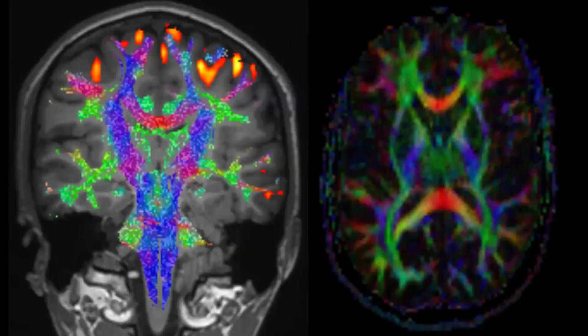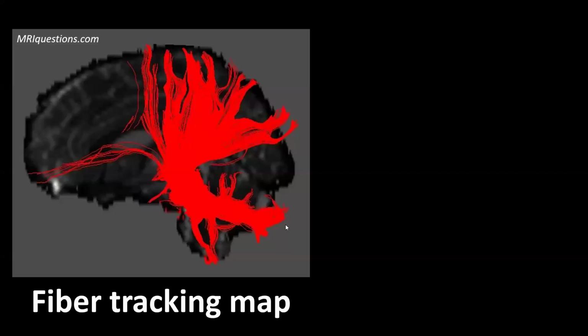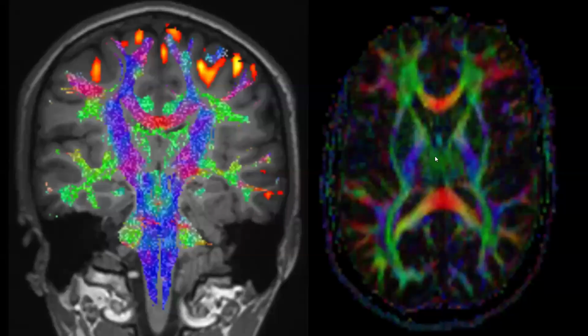And these actually already allow us to distinguish certain white matter bundles. Like for instance, here I selected the corticospinal tract, which goes from the precentral cortex to the brainstem. Here we see very nicely the genu and the splenium of the corpus callosum. We can see the internal capsule and the external capsule. This is going to be the optic radiation. So we can already distinguish them a little, but still it's not easy to look at. You have to scroll through them and you lose track.